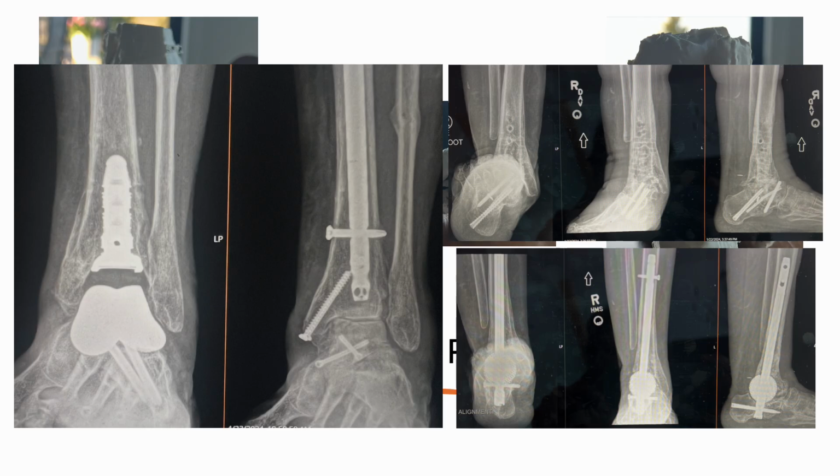This is before Arthrex had their TTC nail, their compression nail, but ultimately restored 3D and the Dyna nail really dialed this one in for me. But you can get great correction, and you get great information by using these products and weight-bearing CT scans to help you really maximize that patient-specific information that helps you make better plans going forward. And that's really what I have today.